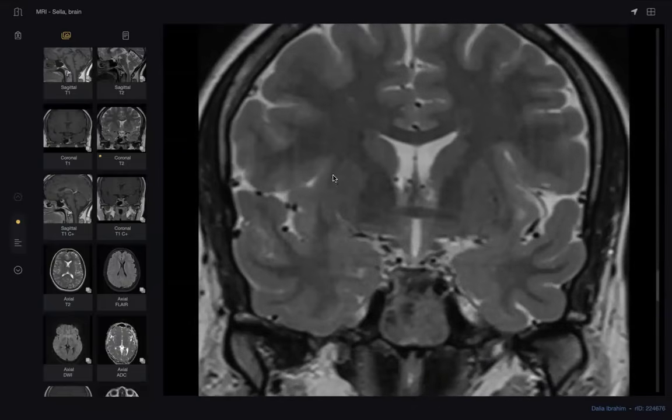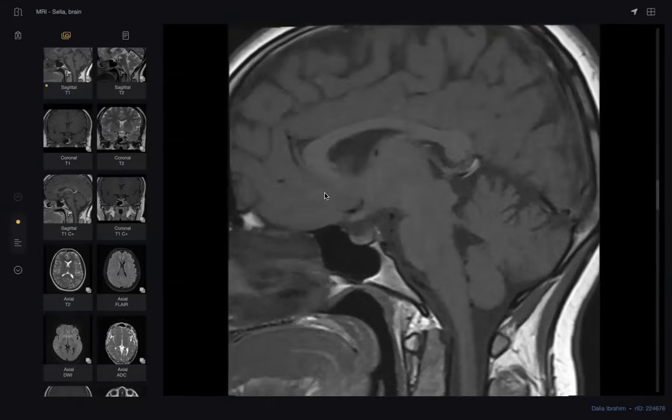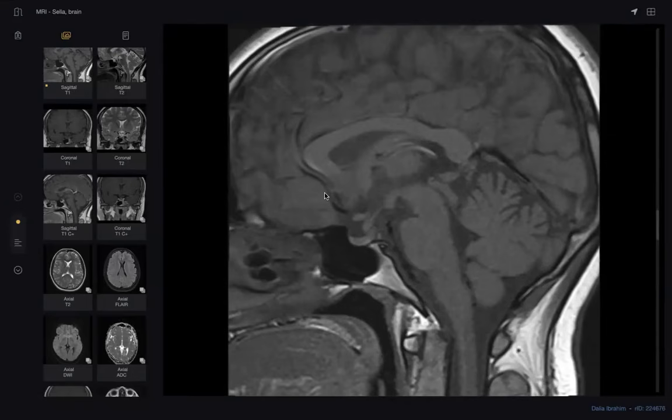I will help you. See what happened here. Tell me what happened in the first slice. I can see this is bulky. Usually the pituitary stalk is thin. What does it mean for you? It means hypophysitis, which could be inflammatory or granulomatous hypophysitis, or eosinophilic granuloma in young age. Yeah, excellent.